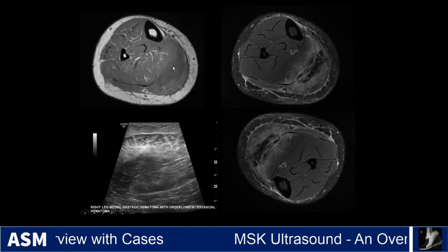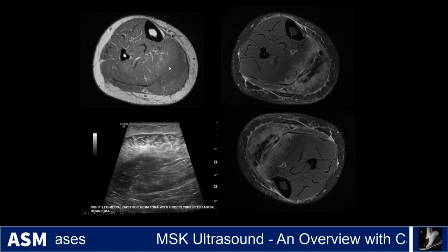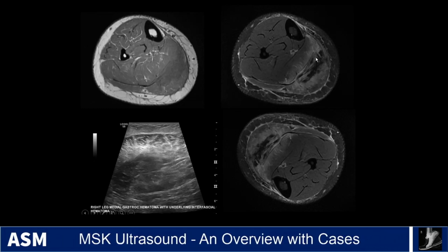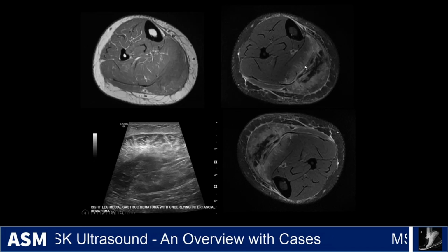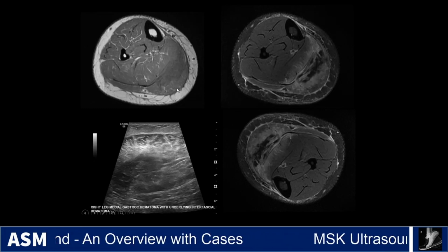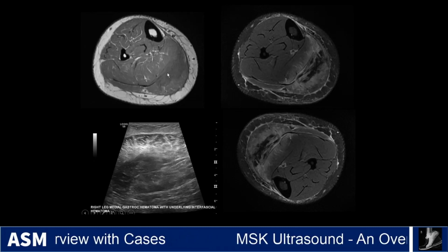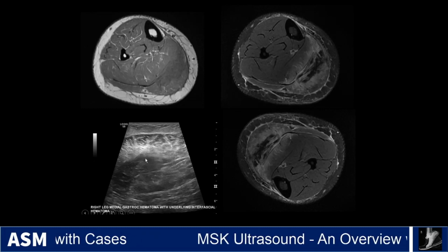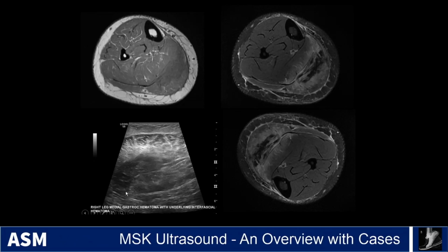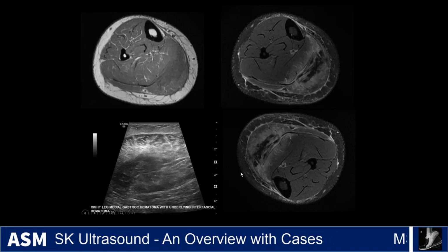This case here, a patient who had an injury during a tennis match with feeling a pop and then swelling in the medial side of their calf, and you can see this now almost chronic appearing, or subacute to chronic appearing hematoma, just because you've got some dark signal intermixed there. There is some intrinsic high T1, but this is an evolving hematoma, and you flipped over here, and so you see the skin here, the overlying medial gastroc here, and then this hematoma in between the gastroc and soleus. So this is a tennis leg type injury.